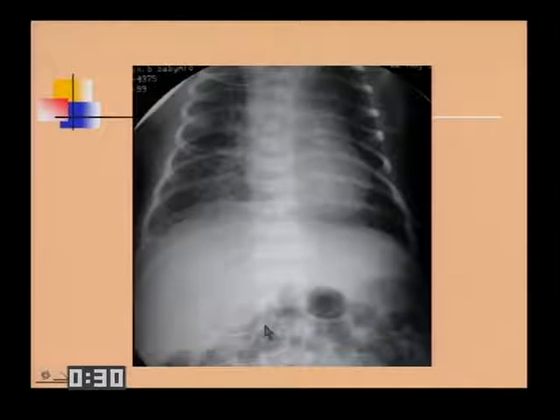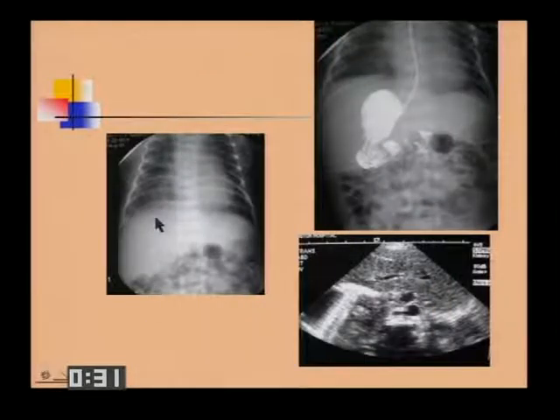But when you see not a total situs inversus where both things are flipped, but the cardiac apex, and by definition some of the things within the chest and the abdomen are flipped, you have to think of heterotaxy syndromes, polysplenias, asplenias, sometimes a little bit of both. The polysplenias have multiple spleens. This is an example of just a heterotaxy without a specific name.